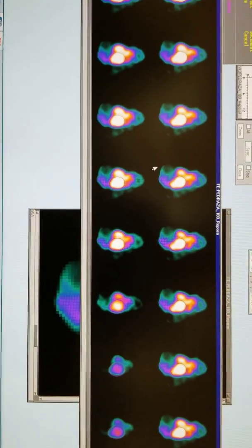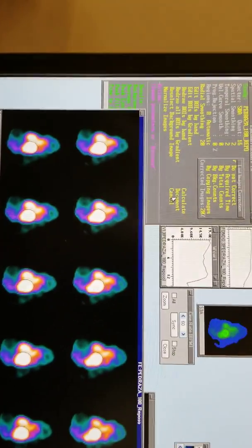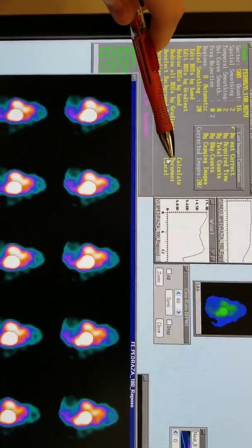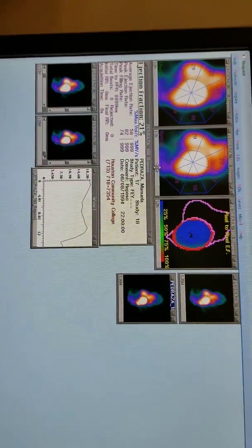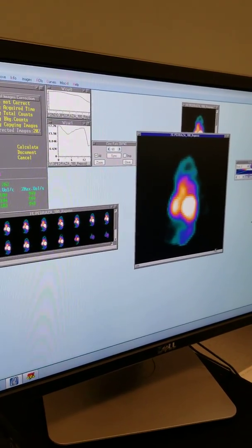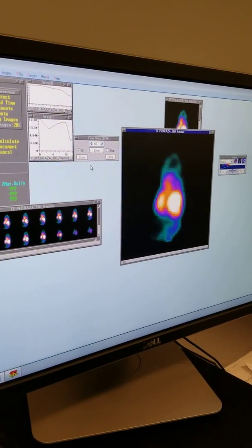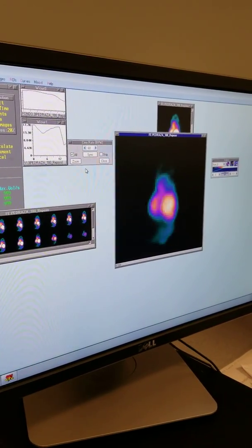Once you're happy with these frames, we're ready to document. Document right here, and this is going to pull your final report. Okay, so delete from your mind what I just said about hitting document. I forgot a very important step.